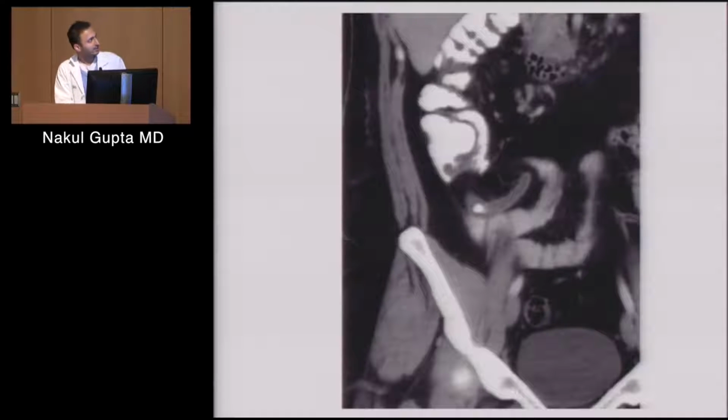All right, acute case. Take a look. This is a coronal CT section. This is the inferior edge of the liver, so we're looking in the right lower quadrant. We have a dilated tubular structure in the right lower quadrant. Here's the cecum. This is the ileocecal valve. You can see it here. So yep, we have appendicitis here. This is a dilated, inflamed appendix.